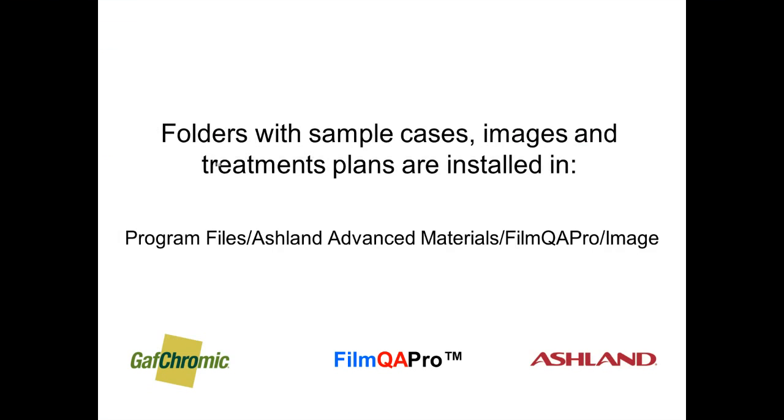In addition to the application, the installation package also contains folders with demonstration files of images of calibration films, dose films, machine QA films, treatment plans, etc. These files are provided so you can work through a case study by yourself, and they are available under Program Files / Ashland Advanced Materials / Film QA Pro / Images.